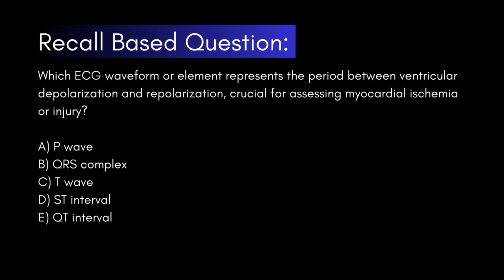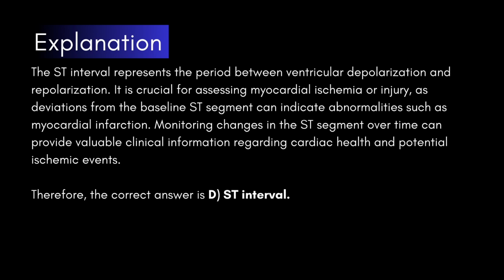Alright, I think I gave you guys enough time there. If you need more time, please feel free to pause the video. Otherwise, moving on now. The ST interval represents the period between ventricular depolarization and repolarization.